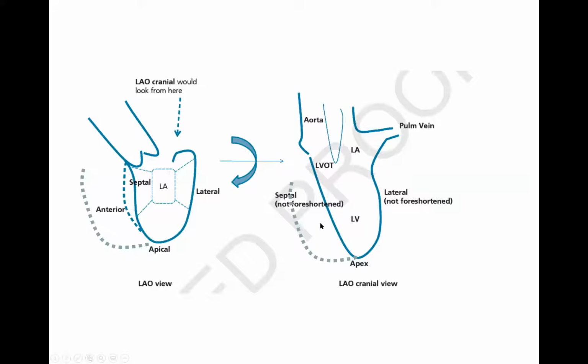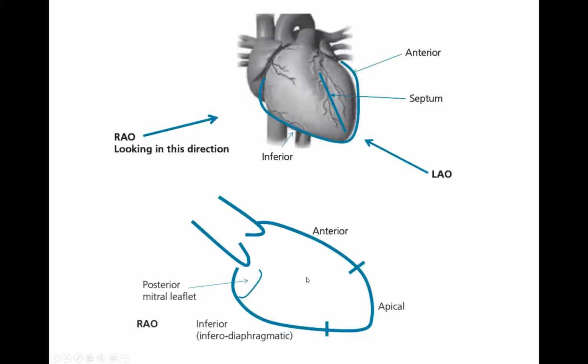This will be important in case you have VSD, VSR, ventricular septal rupture, okay? It's a classic board question that they will show you an LV gram with filling of the right ventricle, and that will be a VSD. It's harder to identify that on an RAO view. I do want you to know that we don't do those very often here, but you will use them in EP a lot. You will use that swinging between LAO, RAO in EP. You just need to understand what ventricle you're looking at and what chamber you're looking at.